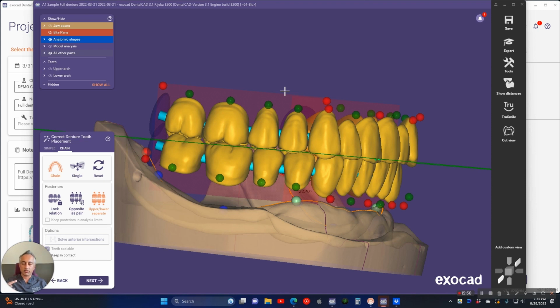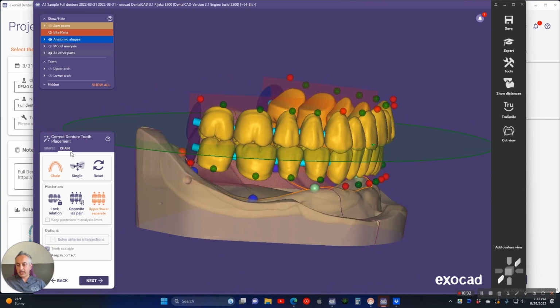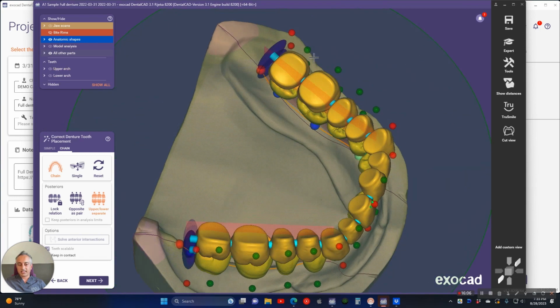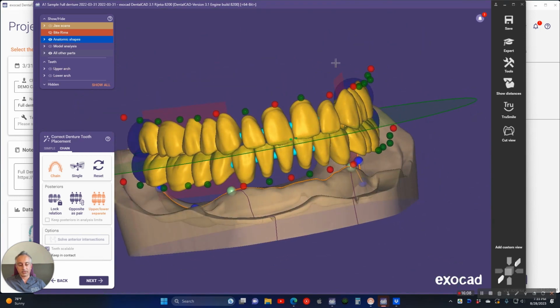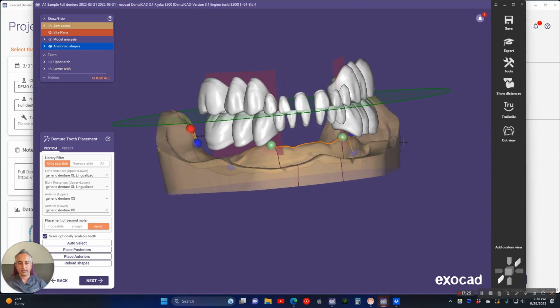There's ways in the partial module to also keep two molars and only one premolar if you want. You don't really need to get that fancy with it. That's a different tutorial. So let's go ahead and maybe mess things up a little bit because there's not really much to do over here. Now we have a pretty messed up bite. We can see what happened here.